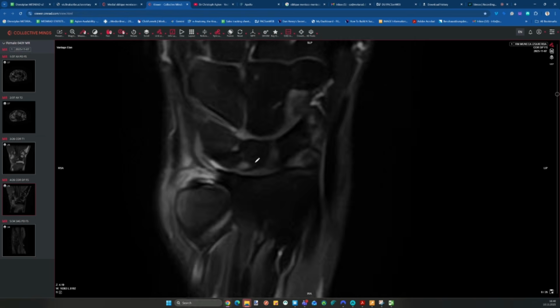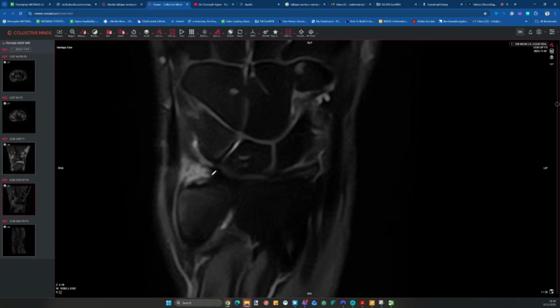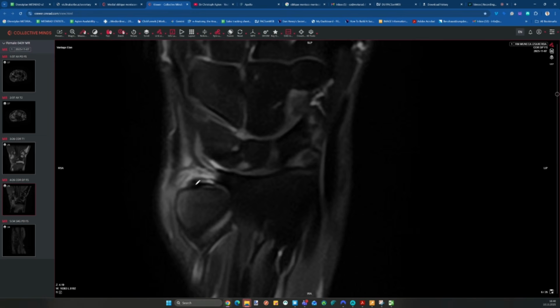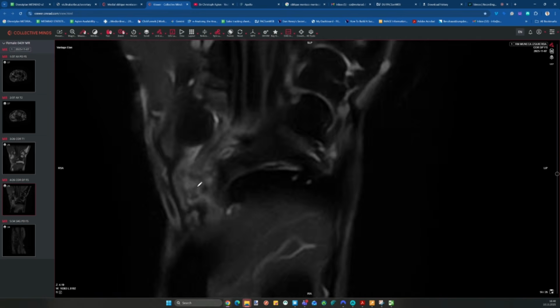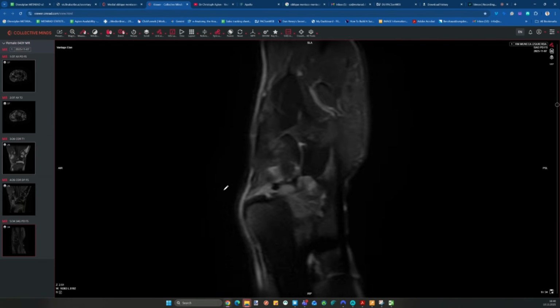I would just call it soft tissue irritation, or chronic irritation, or if you want to go with the sprain route, a chronic sprain of the dorsal radioulnar ligament or dorsal TFCC peripheral attachment. Yes, it doesn't look super acute, but it could be more like a subacute injury. So I think sprain would be my preferred terminology here.